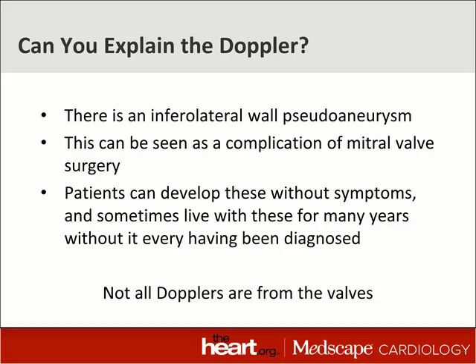So, take-home lesson, not all Dopplers are from valves, and I just thought you'd find this as enjoyable and educational as I did. I've seen pseudoaneurysms before, but never one where the flow velocities were this high and where the pseudoaneurysm was quite this large. My understanding is the patient's doing quite well.